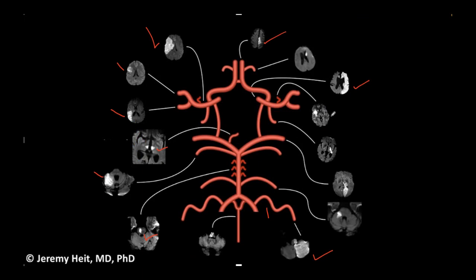These were a little bit different, right? So smaller vessels. Heubner. Artery of Heubner. How about this one? Lenticulostriate, like anterior. The middle. Lenticulostriate would be medial and lateral. Okay? Yeah. So this one was lateral, but as long as you say lenticulostriate, I'm very happy. How about this one? Anterior choroidal. This is PCA. This one is PCA. This one would be anterior choroidal. Anterior choroidal.